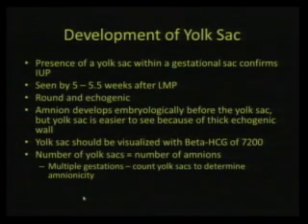And so this is important in multiple gestations. So basically you want to count the yolk sacs to determine the amnionicity. Remember that the amniotic membrane can be very thin sometimes, so it can be very difficult to see. And so yolk sacs are a lot easier to see. So you want to count the number of yolk sacs to determine your amnionicity.